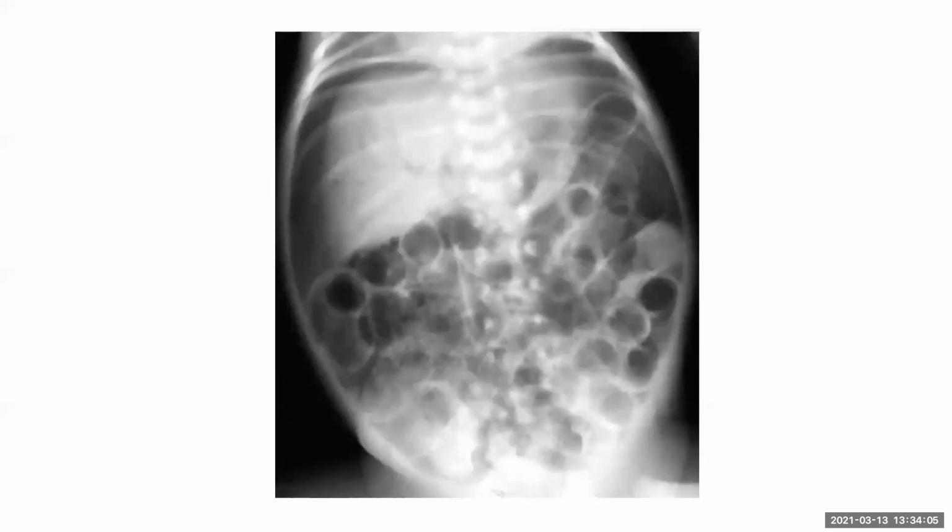So this is a frontal radiograph of a neonate with abdominal distension. I can see there are dilated bowel loops. Also, I can see the wall of some of the bowel loops presenting the Rigler sign, indicating pneumoperitoneum. Also, there is a football sign, a generalized air lucency surrounding the whole abdomen. Also, I can see linear lucency over the liver, which indicates portal venous gas.